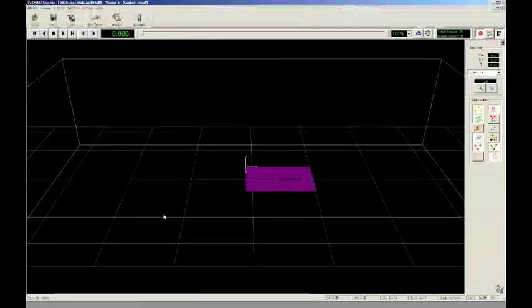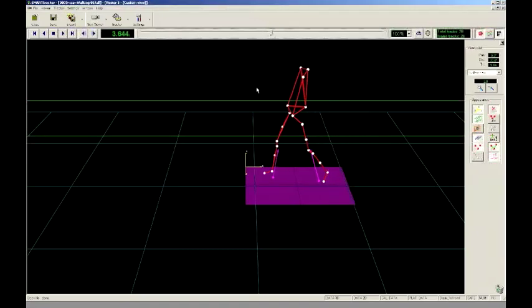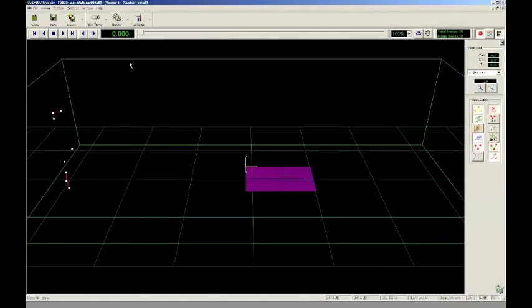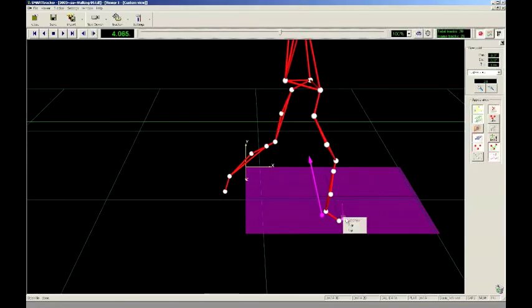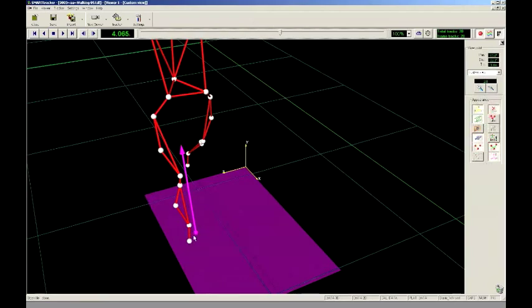Repeat the same procedure for all trials. In this trial, you can see the foot is between two closed force plates. As discussed before, you have the option to merge the two forces to get only one good ground reaction force.